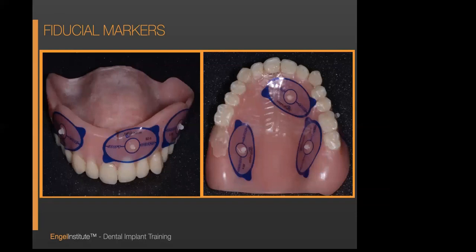And when I say stagger them, just imagine if you were to take an x-ray and it would give you essentially a slice in a pano view. We just don't want those beads to touch. If they do, it's not the end of the world, but we would prefer that one's over here, one over here, one over here, one over here, kind of like you're tightening the nuts and bolts on a wheel on a car. Okay, now there's a couple different ways to do this, but I'm going to tell you my way.